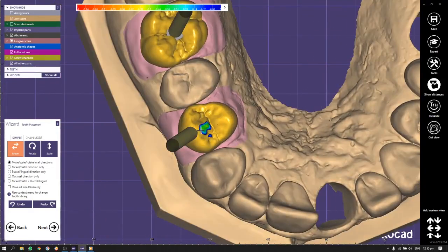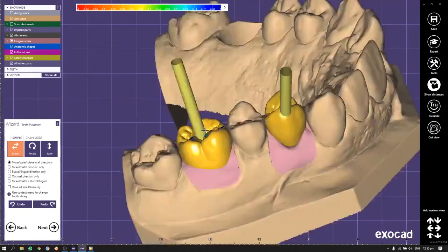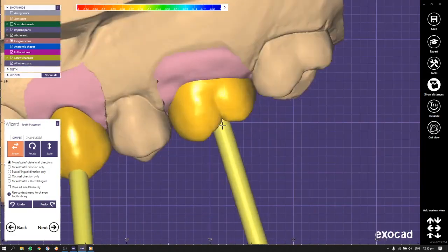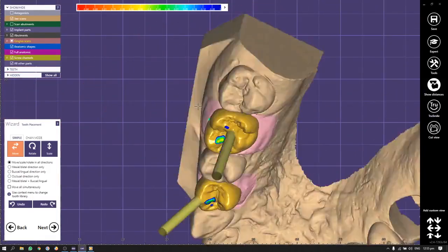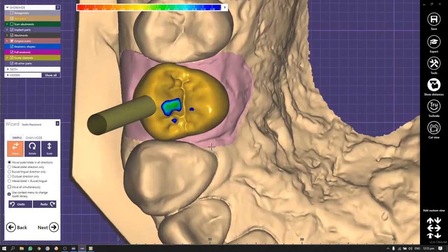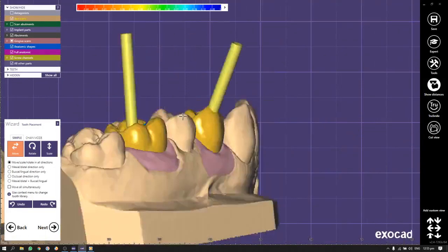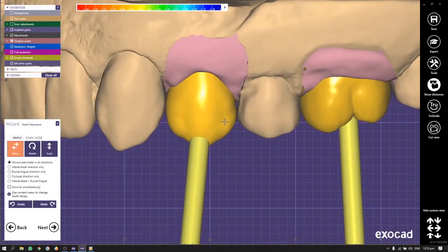In any case, if we are doing the framework, the full anatomy abutment, we are starting from the tooth placement with the setup. So we have to understand how the final restoration would look like. So the placement step is very important even for abutments. We have to correctly integrate the premolar with the antagonist, because it will be our future reference.